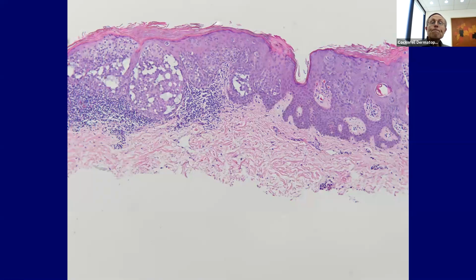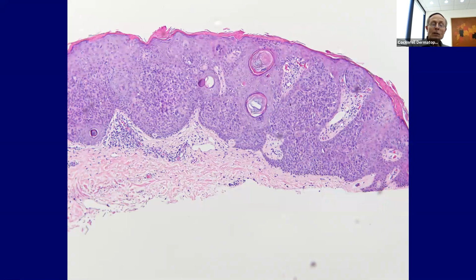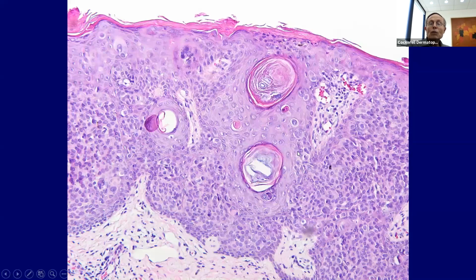But notice there's really not a lot of atypia of these areas. And you've got these little small cuboidal basophilic cells admixed with clear staining cells within it. And there are these horn pseudocysts. Okay, but there's no atypicality. There's no mitotic figures to speak of. There's no ductal differentiation. There's a little bit of pleomorphism here, but not striking atypicality here.